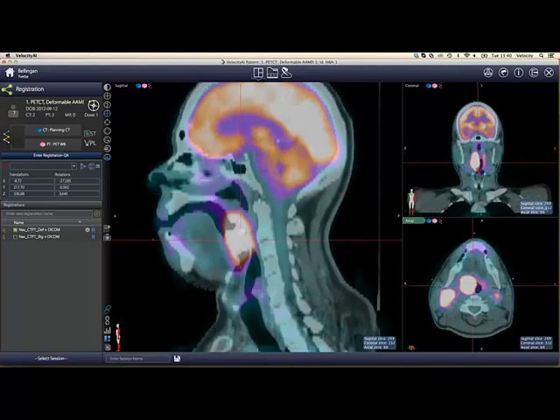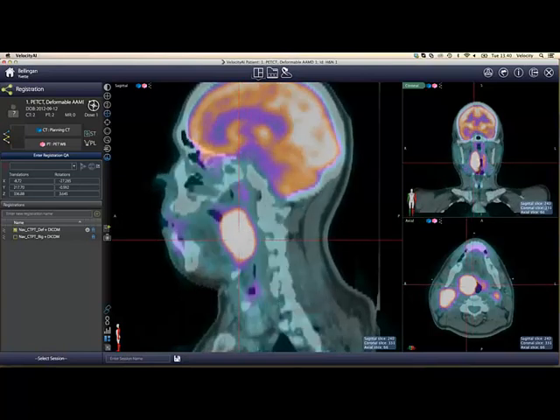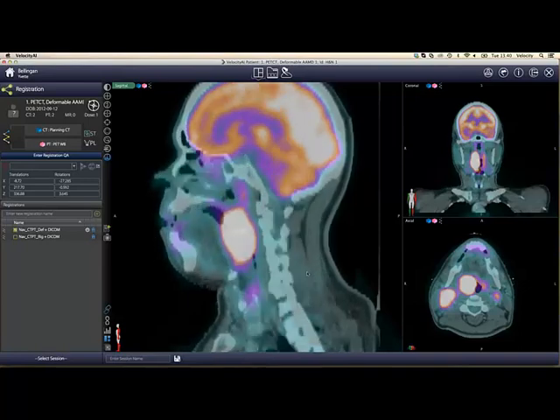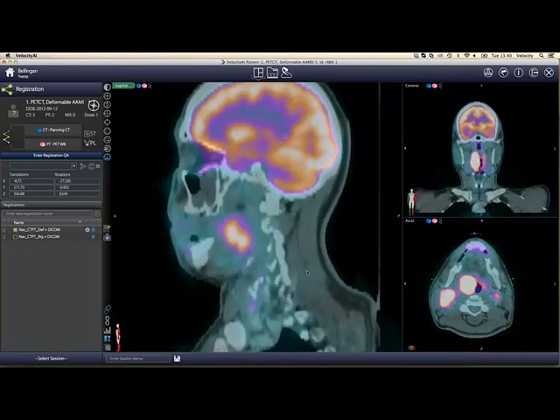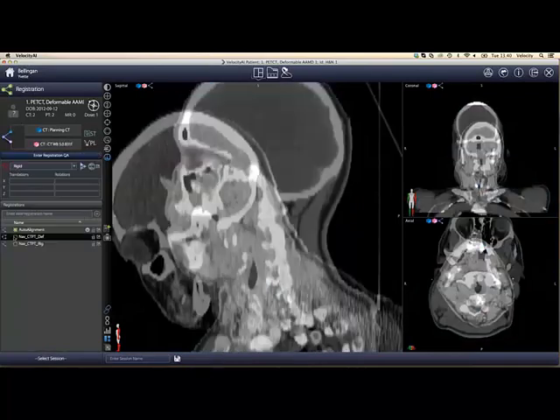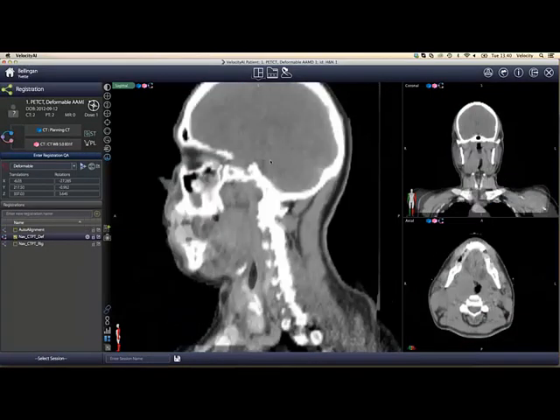So if I look at this, I can scroll through my image and I can just check that my alignment of my tissue is correct. If I know where my nodes are, I can review them as well, and I can have a look, all right? So I can scroll through and change and have a look that everything matches. So that's the one way of doing it with the spyglass.